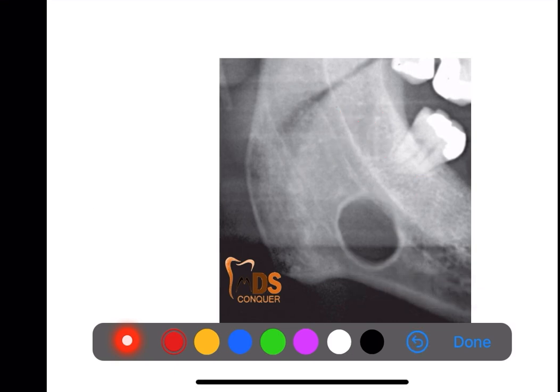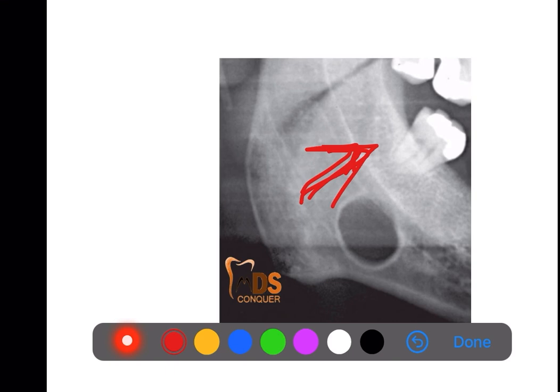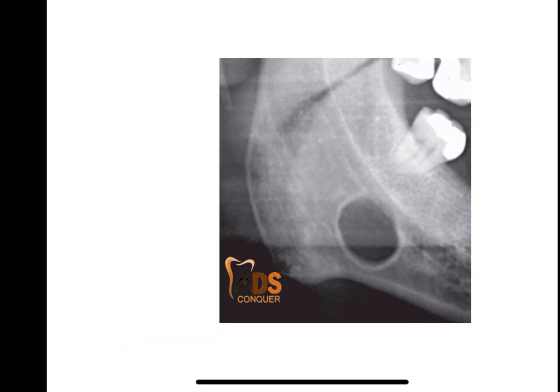And if it rapidly increases or if it is much bigger in size, then it displaces the inferior alveolar canal superiorly. Okay, so if it is bigger in size or increases in size, the canal will be displaced superiorly. That is regarding this particular diagram. There is not much abnormality, so you have to simply go for a developmental defect.